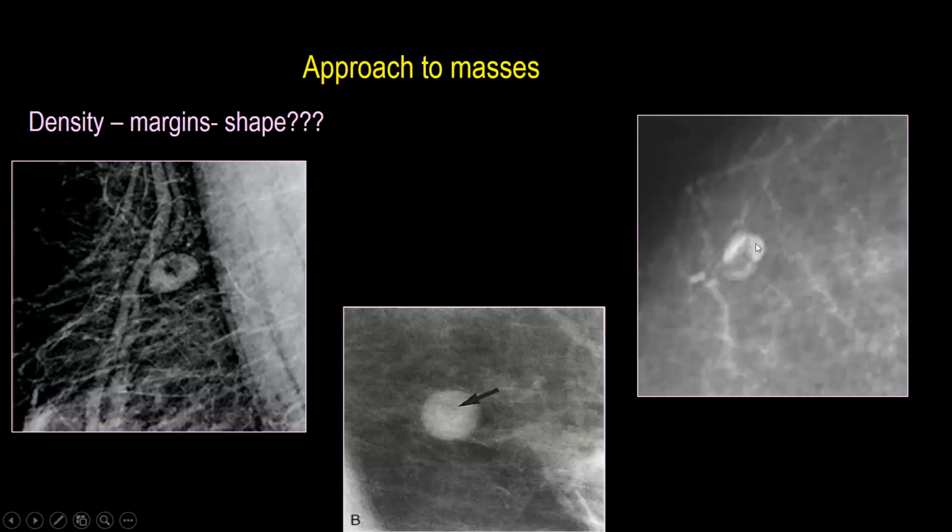I'm talking about another one. Here, can you see? I'm talking about the three at the same time, but take this one. This one, high density compared to what? Why did you take high density? What about this one?